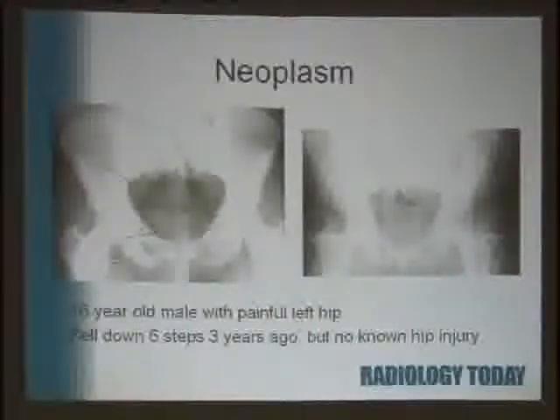Okay. Now, the thing we all dread, and I put it in last, is neoplasm. We have a new feature at our hospital where it comes out with these big, huge arrows, so it costs more. It shows where the answer is. No, somebody put these on it, and I could not figure out how to get them off, but at least they don't flash.